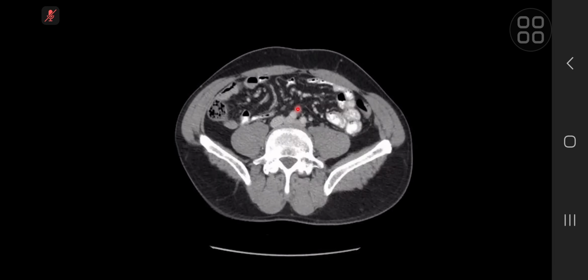And here you are. This is the lesion which we were looking at on the barium examination, and look at the mesentery. Mesenteric metastasis is much larger. So we missed a lesion in the liver, and later on an MR was done. On MR, we can see an arterially enhancing lesion here and shows signal loss, washout. This is a malignant lesion.